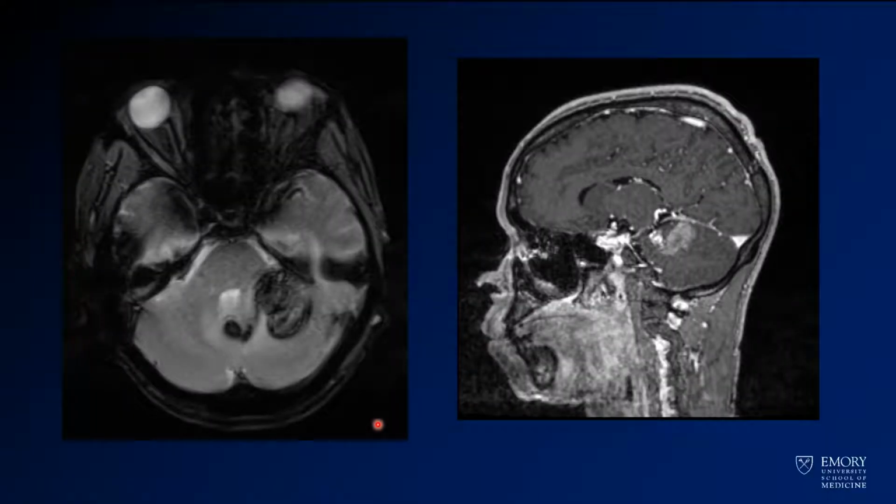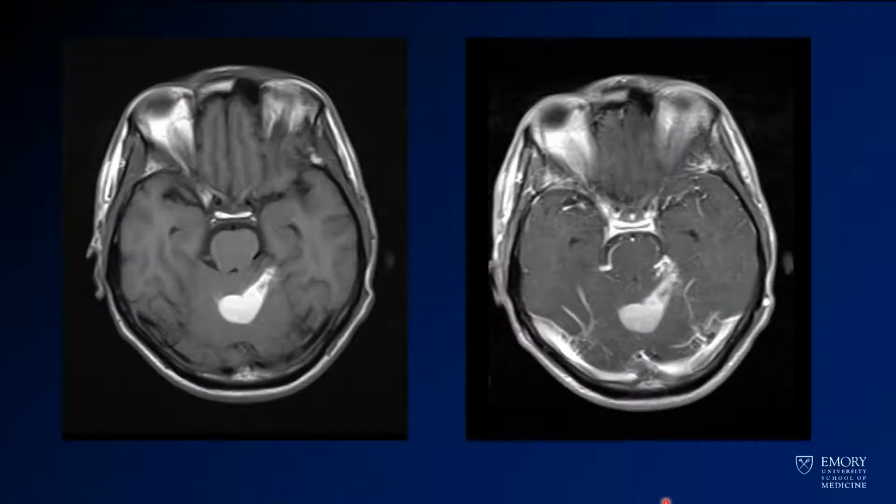Here you see an MR from that same patient. So you see on the gradient imaging, there's a lot of susceptibility around hemorrhage here. And then you see a lot of enhancement. So some of it's enhancement associated with the hemorrhage. But here you see the little nidus of abnormal vessels there. Here you see pre and post contrast imaging. So on your T1, the hemorrhage itself has a lot of intrinsic T1 hyperintensity or T1 shortening, but you definitely see an area of vascular enhancement where we were seeing abnormal enhancement on the CT angiogram.